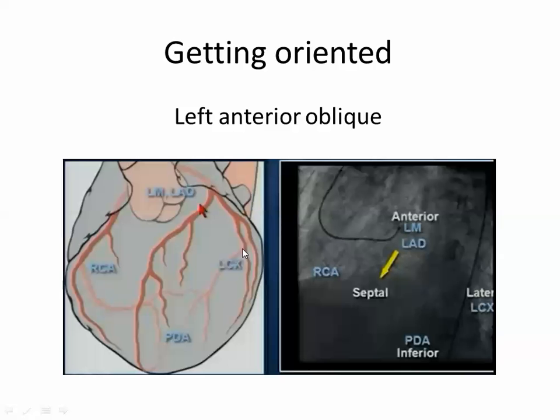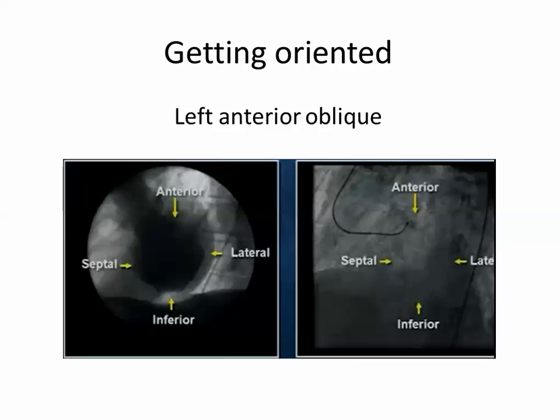Where is the atrioventricular sulcus in this graph? It is circular, the sulcus is circular, lateral. And here, with the RV, will be here. So the RCA will come here, and this was with the LAD and the LCX.